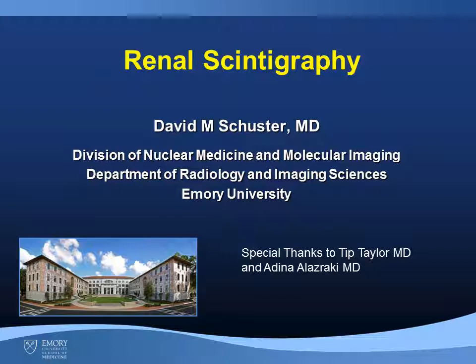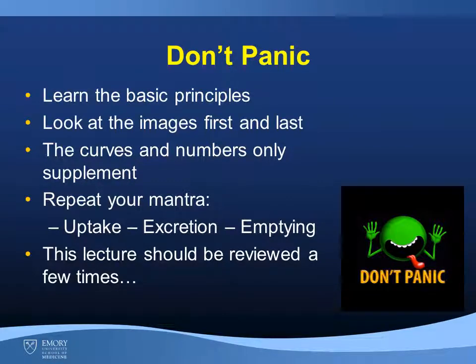This subject may seem daunting at first, so don't panic. If you learn the basic principles and remember to look at the images first and last, and that the curves and numbers only supplement the images, then you will have a good basic understanding of renal scintigraphy. And repeat your mantra of uptake, excretion, emptying. And we're going to be revisiting that mantra throughout this talk.